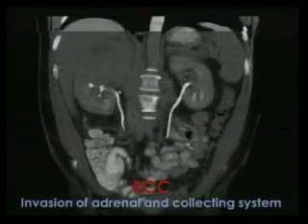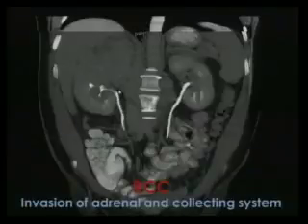With the CT, we can create all these fancy reconstructions simulating IVP, and we can see how the right-sided collecting system is irregular with areas of non-opacification, and this is related to compression and invasion from the adjacent tumor.